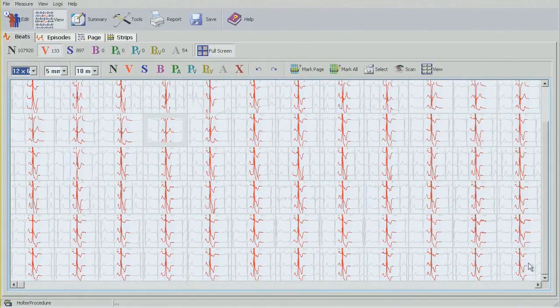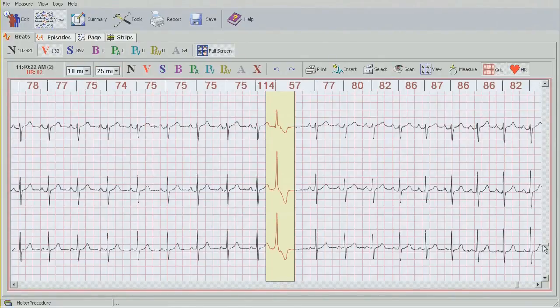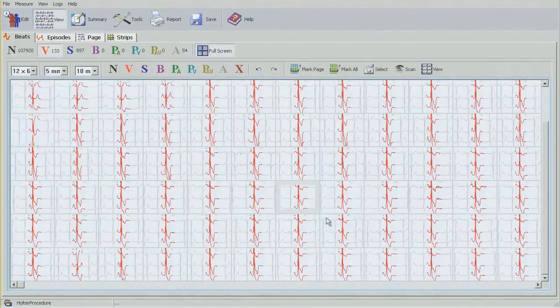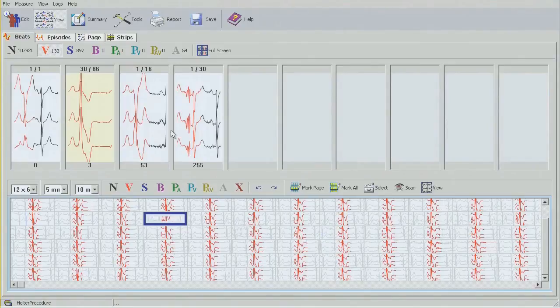Now keep in mind, at the bottom here, you're not actually at the very bottom of the page. In order to get there, you need to double click on the last box, scroll all the way down, and double click again. This shows you all the rest of the characters there. So I'm satisfied. These are all ventricular. Again, tagging any of these beats and using the Z button to go back to the bins.